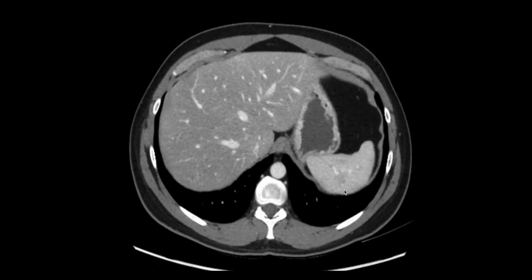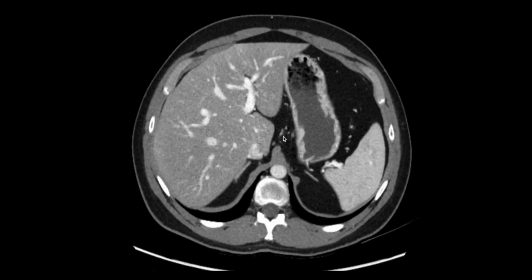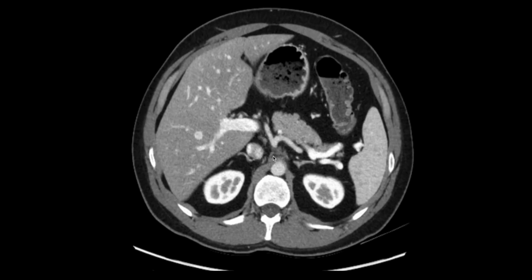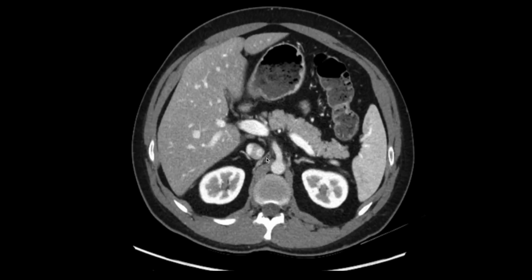The key lymph node territories include the gastrohepatic ligament, which only has a few small lymph nodes and is particularly important when staging esophageal or gastric cancer. Here, at the origin of the celiac artery, are these linear, sort of ill-defined structures, which are the celiac ganglia.